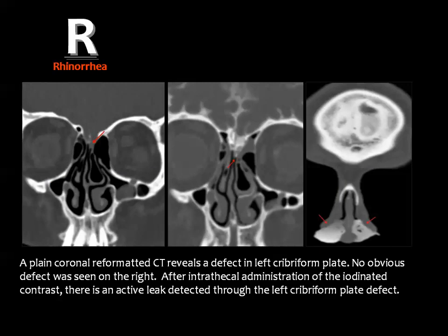And many times we used to put some cotton pledgets in the nasal fossa and look for their staining by the injected contrast material. This is one of the confirmatory findings if there is CSF rhinorrhea. And you know that rhinorrhea may be mistaken for allergic sinusitis, and you are not sure about the fluid coming from the nose if it represents the inflammatory sinus secretion or CSF.